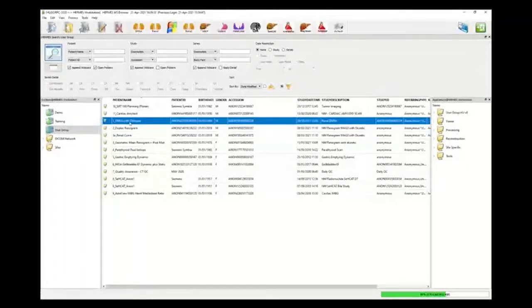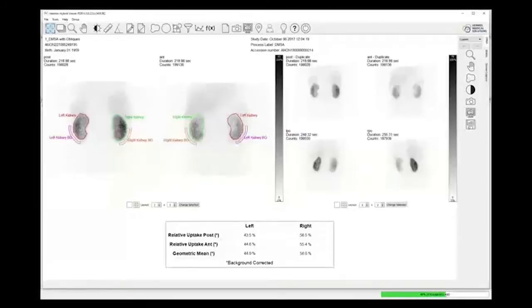Okay. Perfect. So first of all, I'm going to show you DMSA. I'm going to be using the DMSA application here to show you both the improved display and print configurability that I alluded to in the last slide, but also the new features specific to the DMSA application itself. I'm just going to move this out of the way because I don't know whether you can see this too. There we go. Sorry, too many screens open.